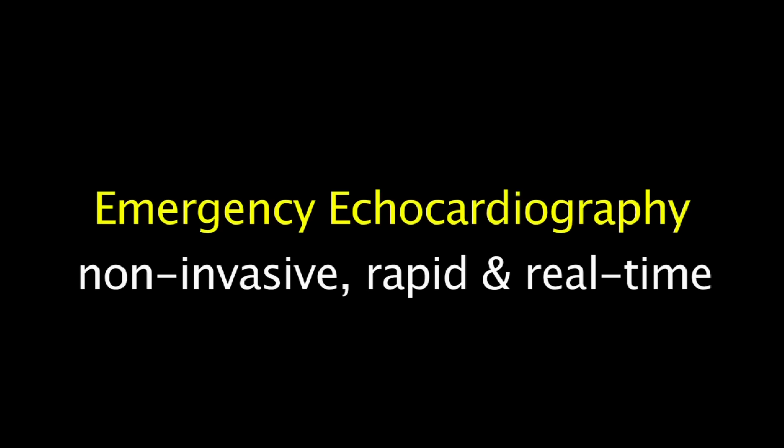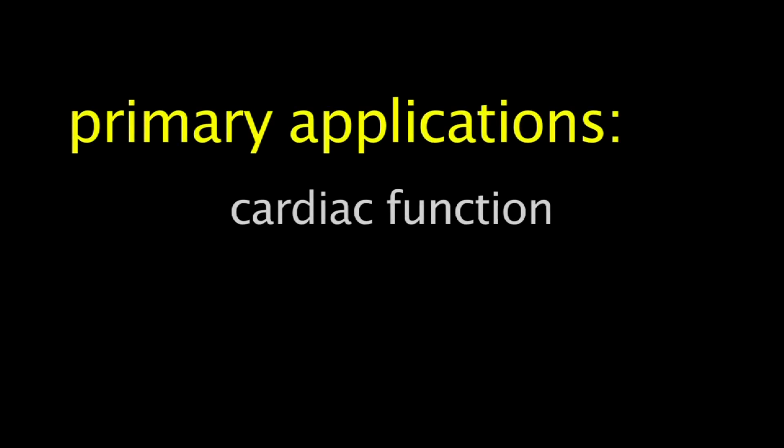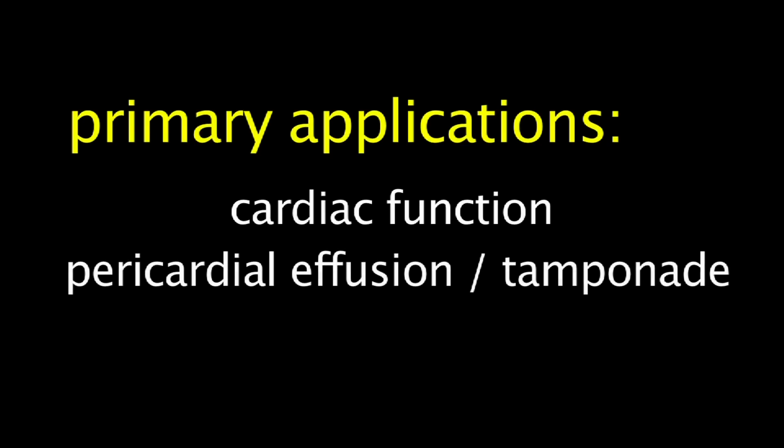Emergency echocardiography is a non-invasive, rapid, and real-time method of evaluating patients suspected of having cardiac or pericardial disease in the acute setting. The primary applications of the limited cardiac ultrasound are to evaluate cardiac function and to diagnose or exclude pericardial effusions and/or cardiac tamponade.